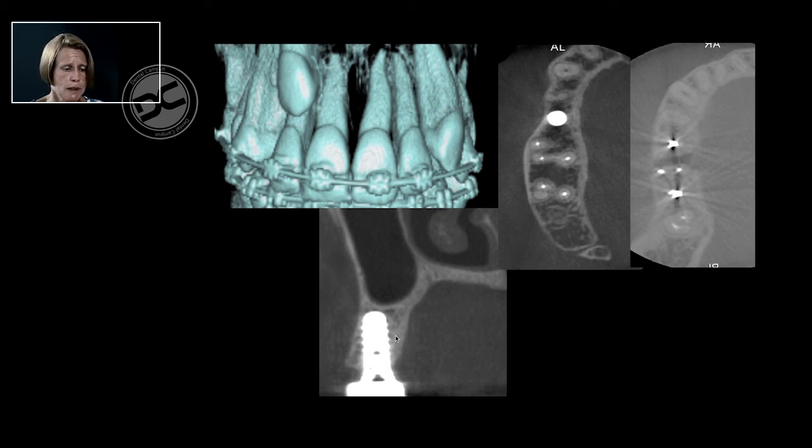But when we come to these two images, you see that they are from the same right upper jaw with metal in the teeth in both cases, and yet a completely different performance. There's no artifact around this implant, and there's no artifact around those fillings in the molars. Yet if we take this patient, we see a lot of artifacts and therefore also a detrimental effect on the diagnostic image quality. How is this possible, such a difference?